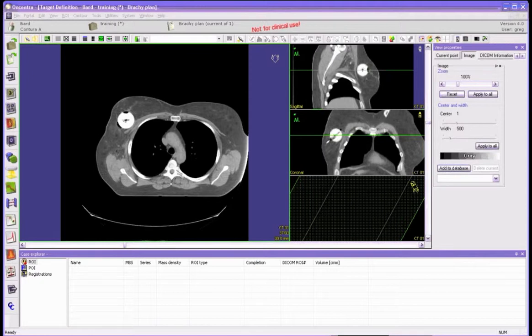The first case is pretty much a plain vanilla case, and so it will be very simple, and we'll use that as an illustration about how you create all the structures and all that kind of stuff, and how you do the optimization in a simple way. In a more advanced presentation, we'll go in a little bit more depth about optimization and evaluation.